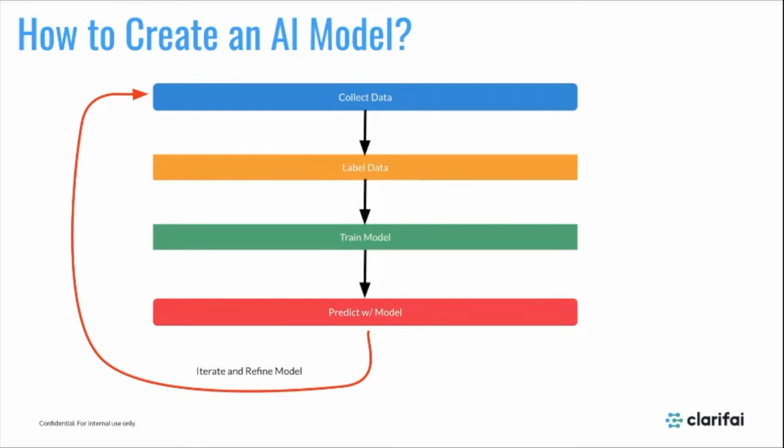All the models are trained by example, so you have to give it a good classification of what COVID looks like versus not COVID, for example. So labeling data, and how we go about doing that. Obviously training the model, making sure it can actually learn from all of the data that we've collected. And then finally, using the model, predicting, evaluating the model, and then how do we quickly iterate on this as well. All right.